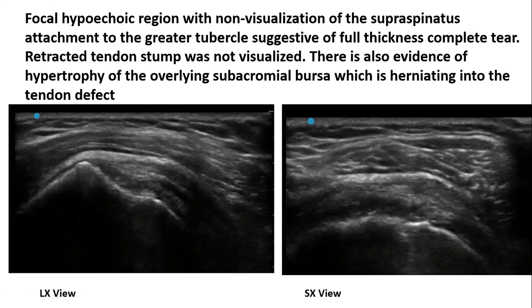That's good. Let me see if someone else tried to type. Okay, Brad has some difficulties. Brad is saying that he has difficulty with these types of patients, and I know a convex or a straight line from the lesser tuberosity is a problem, but my main clue is lack of seeing muscle tissue striation, fibrillation. If you're saying lesser tuberosity, I think you're talking about subscapularis, right, Brad?